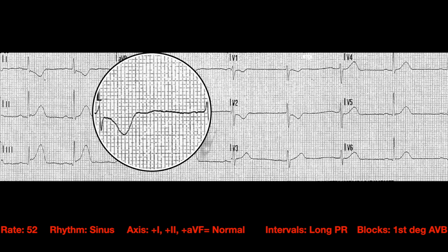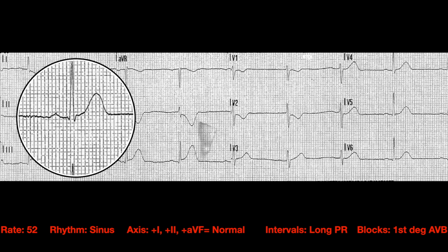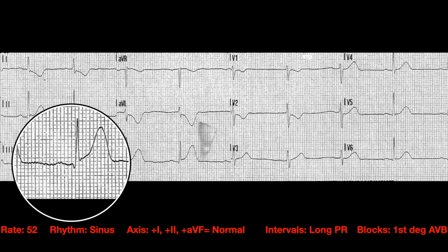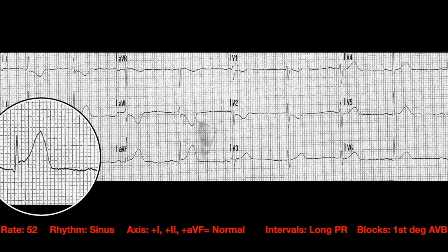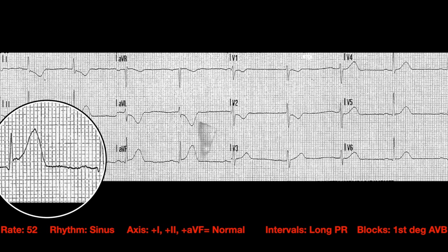When we look through the inferior leads, we start with lead 2, and maybe there's a hint of depression there, or a hint of elevation there, not too awful much. But when we get to lead 3, we see it a bit more prominently, depending, again, on which TP segment you compare to, which baseline you compare to. That looks like more than a millimeter.